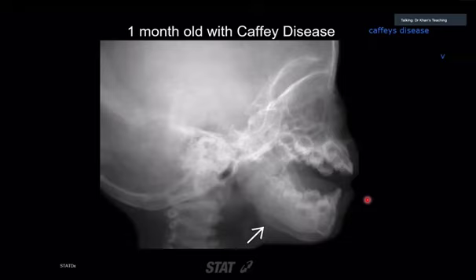And the examiner will show you this kind of film. They might start with this film. Look at this film, and you might be going right and left. Pituitary fossa is this, teeth are this. Actually, what is the finding? The finding is that this is the outline of the mandible. Look from here till here, right? But this is something extra. And this something which is extra is periosteal reaction, and means that this is Caffey's disease. So remember this film. This is from StatDx.